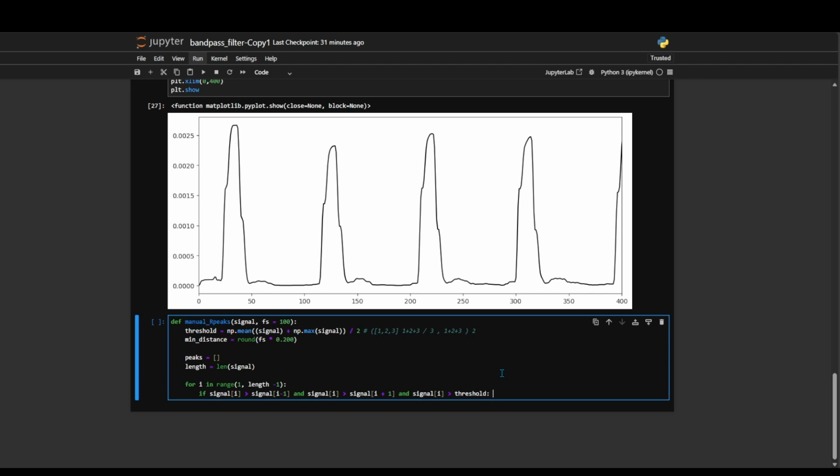So a quick explanation of what it does. It will look for the highest number between two neighboring values. So for example, again, our signal looks like this: 0, 1, 2, 3, 4, 5. Let's say we're working with this value. It will look at the neighboring values, 2, 3, and 4. It needs to be higher than both neighboring values.